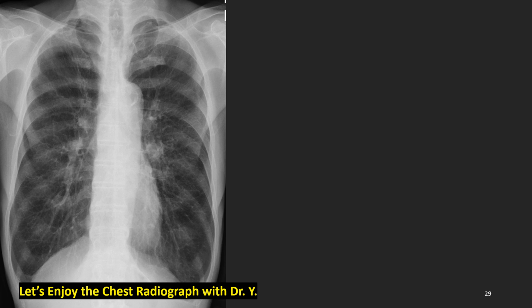What's wrong with this patient? Yes, the thorax is longer than usual. This usually means emphysematous lung. What else? Not yet? Okay, let's go further.